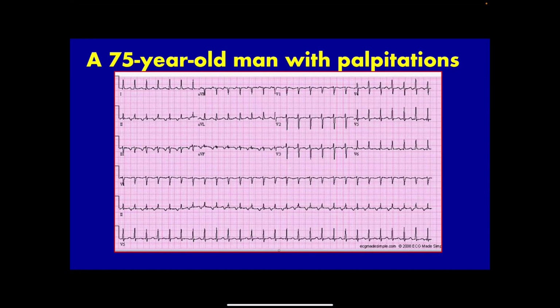So first thing is you look at the rate. Okay, always first, you look here on the strip that's down. We look at the rate. Between each QRS complex, you have like 1.5 boxes. That is definitely tachycardia. Once you find that this is tachycardia, you follow the tachyarrhythmia table that I showed you. So first thing is you check the QRS complex. Is it narrow or wide? It's very narrow, okay, which is like the normal QRS complex, it's narrow.